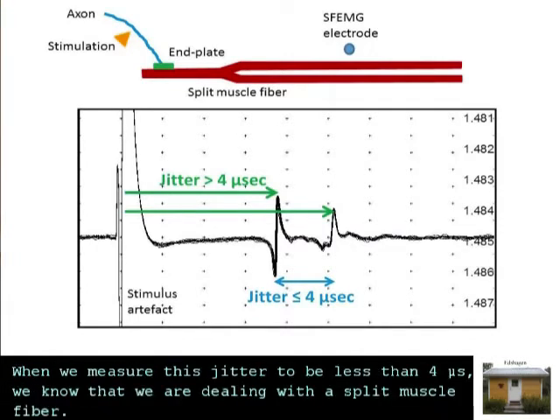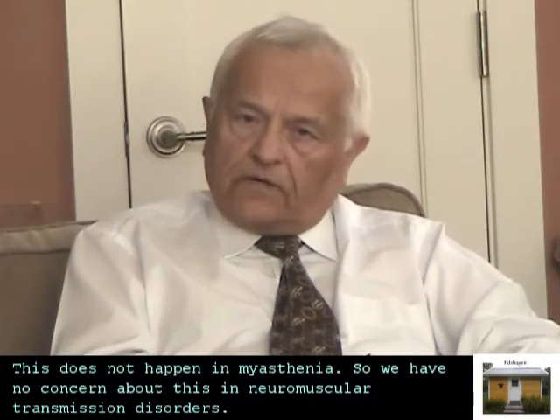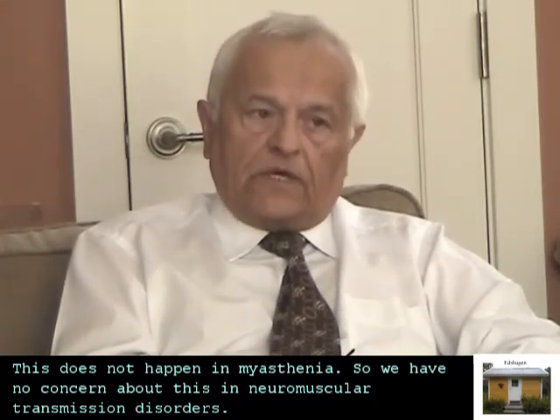And when we measure this jitter to be less than 4 microseconds, we know that we are dealing with a split muscle fiber. This does not happen in myasthenia, so we have no concern about this in neuromuscular transmission disorders, actually.